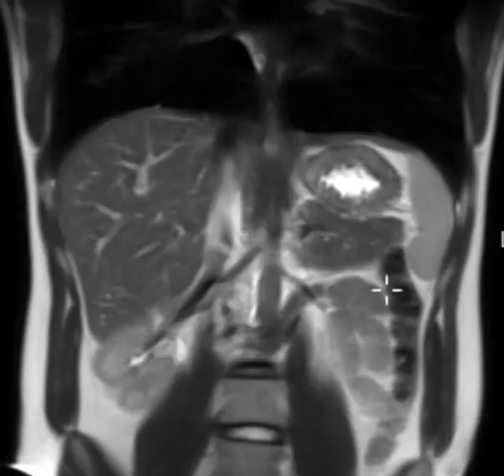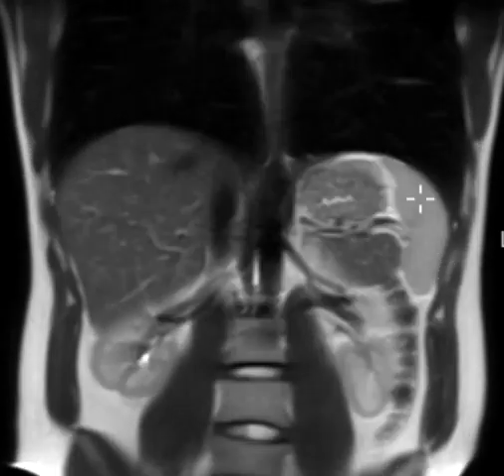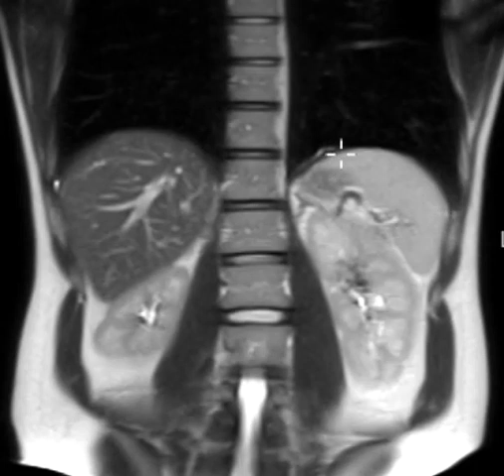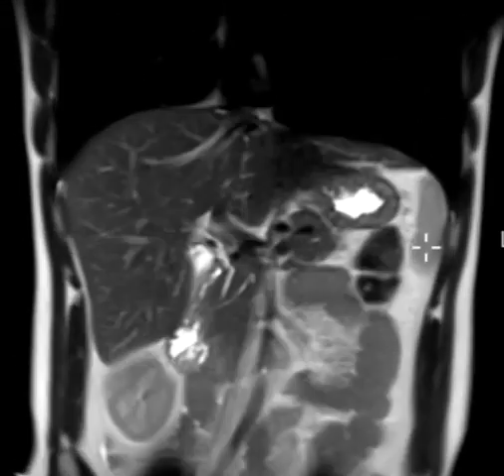On this view called a coronal image, we see this structure is the spleen here in the left upper quadrant. A lot of times it's right beneath the diaphragm like this. Hugs the bottom of the diaphragm. Again, here's the liver, looks a little darker. The spleen again is very uniform, nice homogeneous in signal intensity.